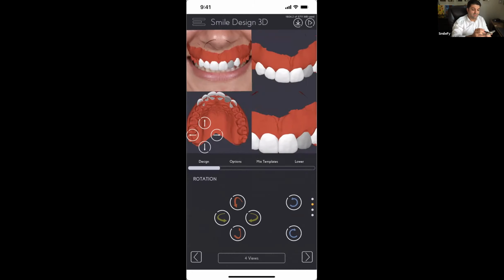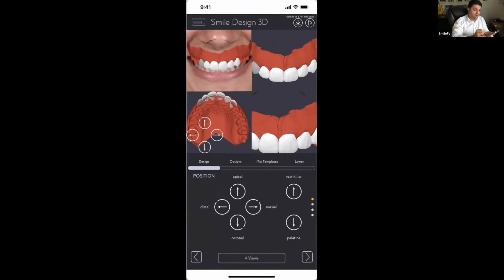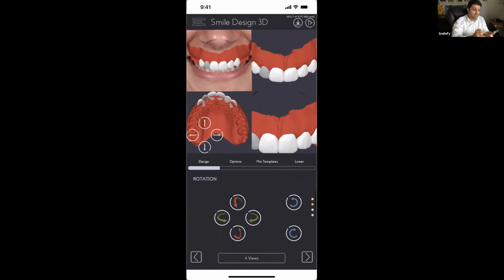Everything is, you see, facially driven. It's everything what we do. We have the face. We have everything on our 4 views. And I'm gonna play cool, and I'm gonna pretend that I see everything properly without going like this. You see, soon I'm gonna need glasses. So I think the design is fine.